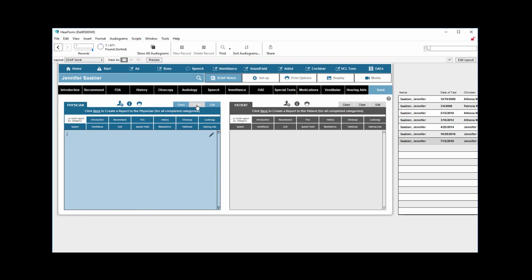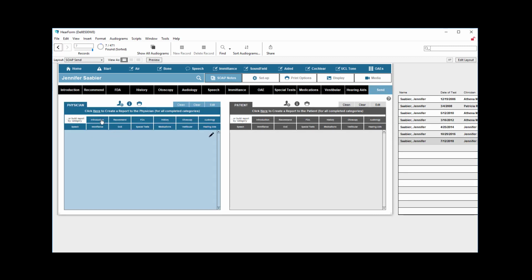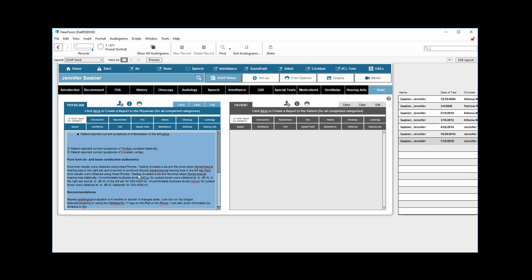Let's go ahead and clear that. For example, I could put introduction, then history, then otoscopy, and it will put those in whatever order I want, but I can also just click, let's go back here, I did that wrong. I could put the introduction here, and then history, and then audiology, and then end it with recommendations. So excuse me, I did that wrong before. But as you can see, it's in the order I want it. If you're going to do it that way all the time, then just ask us for help and we'll rearrange things for you as far as the final output.